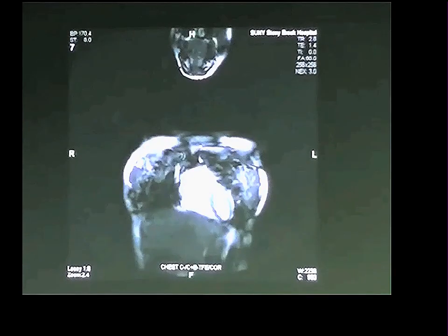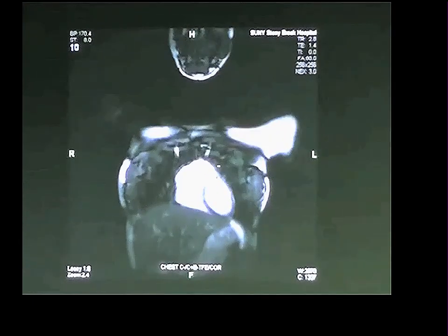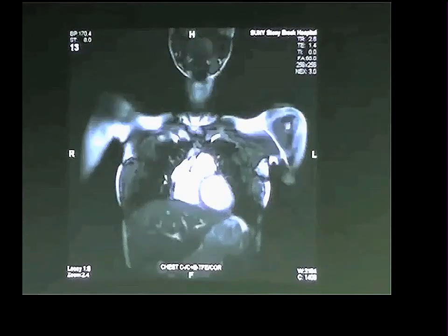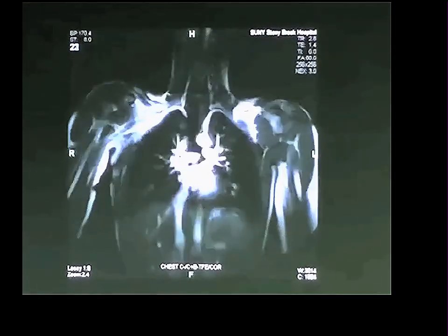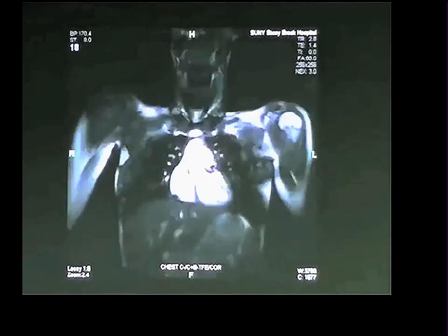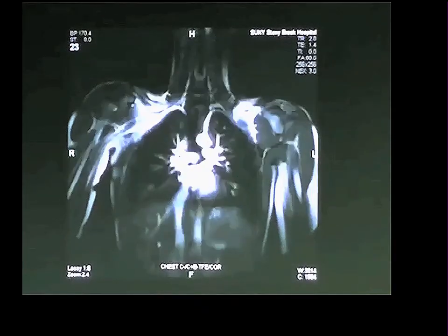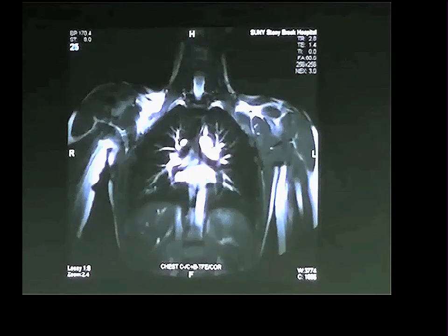So again, the anterior chamber of the heart's right ventricle, left ventricle. We follow the right ventricle up to the pulmonary infundibulum, then to the pulmonary trunk, and the bifurcation of the pulmonary trunk into right and left, and we see the right pulmonary artery running on the roof of the left atrium, as I said. If we go back again, we see the left ventricle giving rise to the aortic valve, the ascending aorta, and again, arch of aorta, brachiocephalic artery, left common carotid artery, and subclavian. So you just see these things as well as if you were dissecting. It's called a magnetic resonance angiogram.